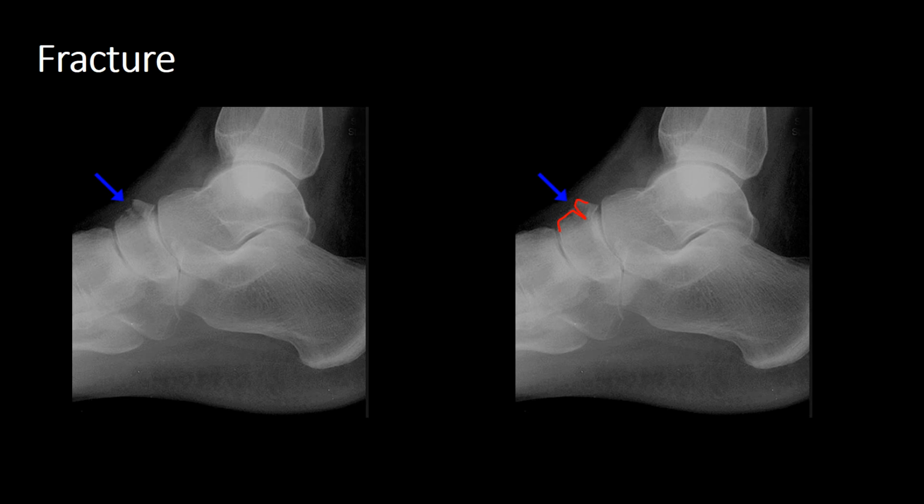Now this is another common fracture of the navicular. This is a fracture of the dorsal cortex, and it's a small avulsion fracture, and again this won't be appreciated on either DP or DP oblique view, and this really does demonstrate the importance of why you need to have a lateral view if you ever have any question about injury to the tarsal bones.